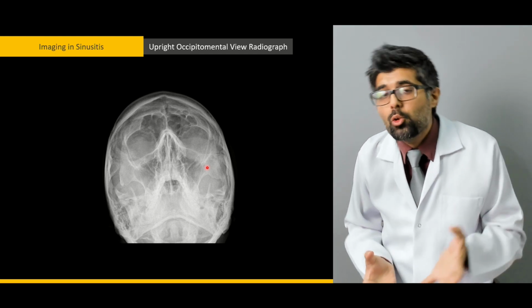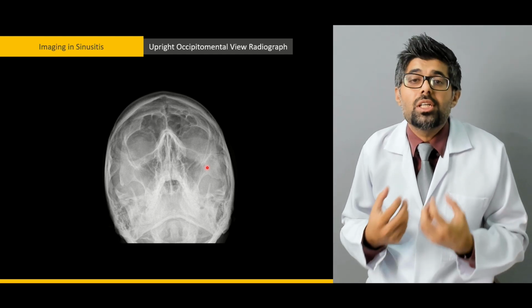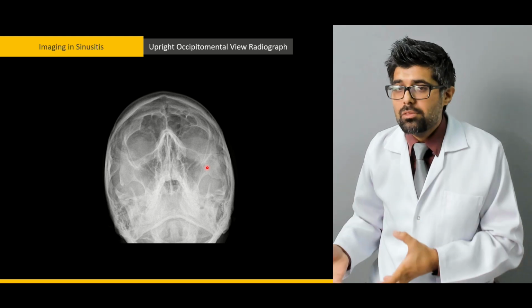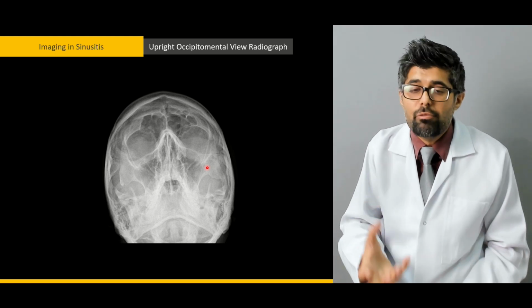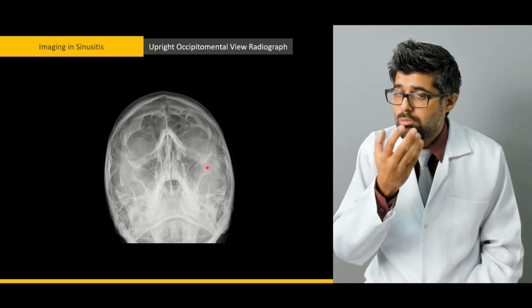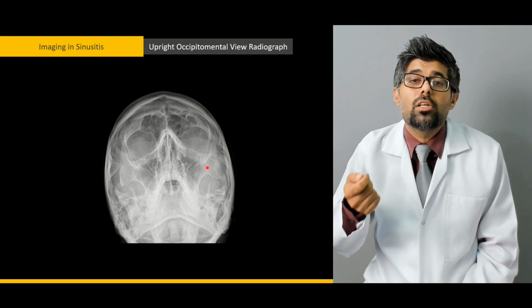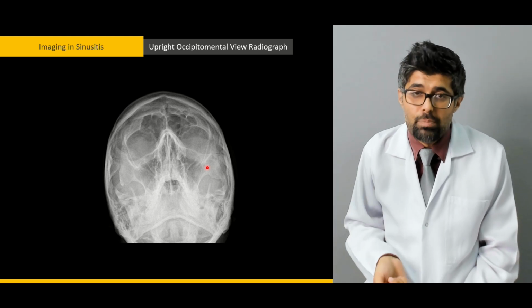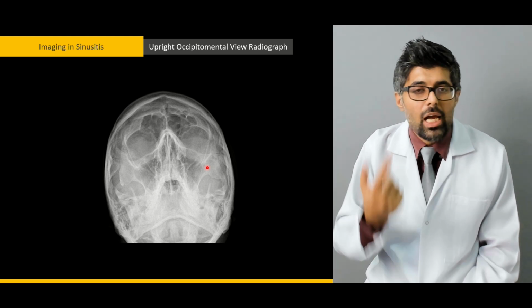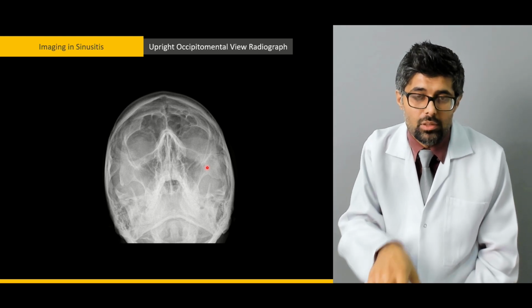Is the discharge going away? Is the discharge going down? What is happening to the patient? Every time, instead of the CT scan, we can perform this radiograph. This not only saves time, saves money, but it's also easier for the patient. It is done by placing both the chin and the nose of the patient on the radiograph.